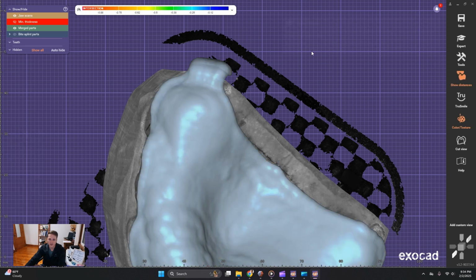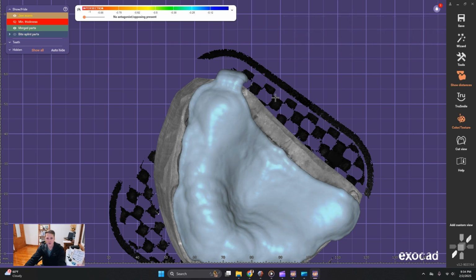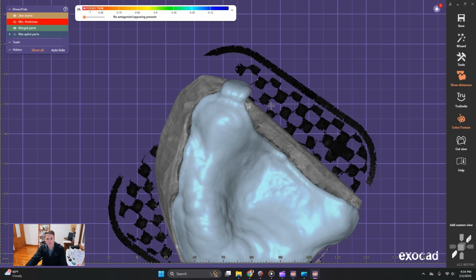Always say yes to save your modifications after, because when you go through the whole process and get to that final stage where it looks like you can choose, make the model, I'm done, expert mode, it goes ahead and exports those files for you. So what you want to do is modify that file, or it's never going to change if you do all this work after and you don't hit save for modifications. It's not going to change the tray that you originally exported.